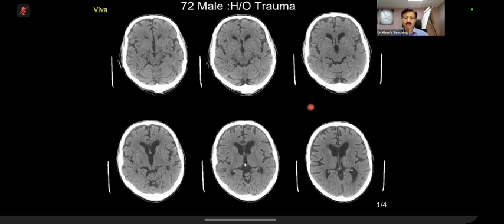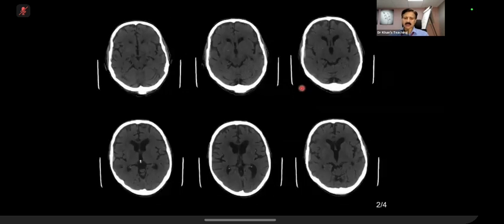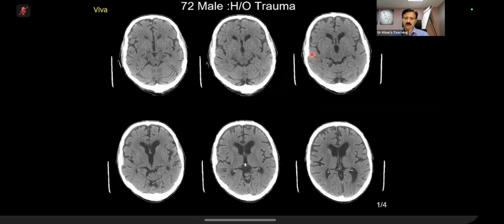There is a window, we call it the subdural window, or subdural hematoma window. This is used only in cases of acute trauma. Subdural hematoma can be chronic, so it's useless there. The basic concept is that in this case, there was a subdural hematoma here. We missed it. And actually, it was visible on this window. If you see, this is known as the subdural window. I'll give you the windows shortly. And there is a subtle finding. So what happens is the hematoma and the bone become conspicuous by different densities. On the regular window, it doesn't.